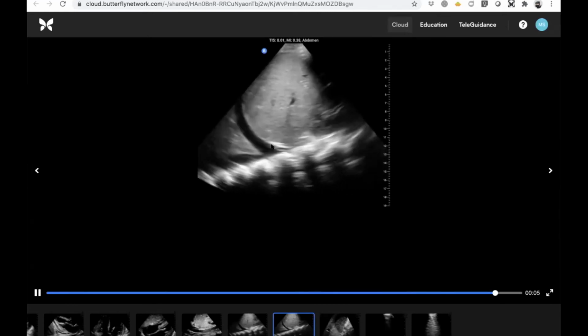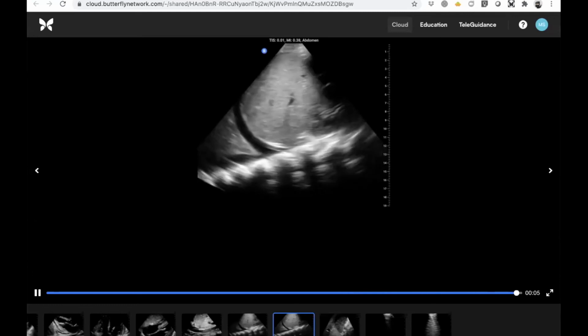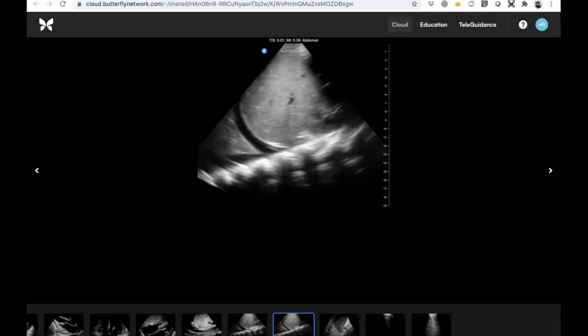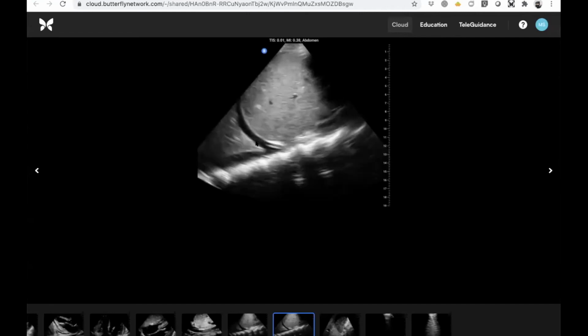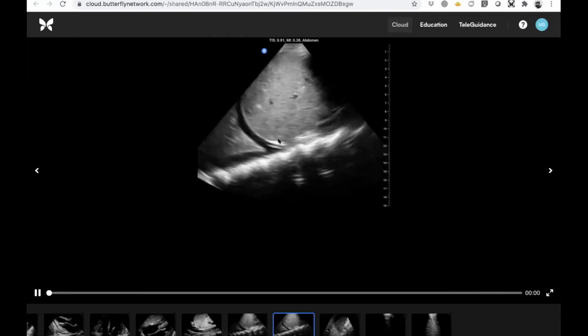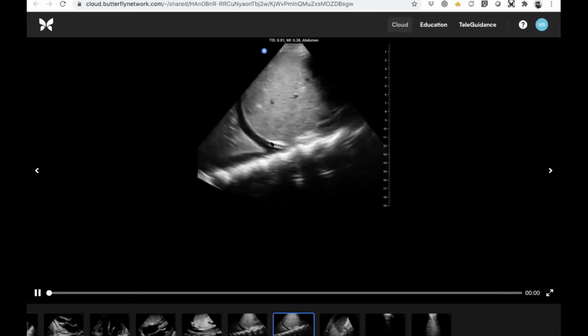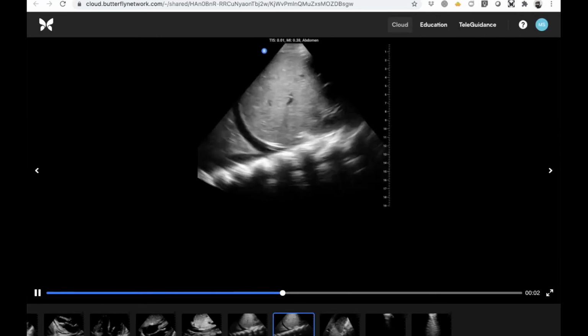One thing, you drop all these pearls that we just move quickly past. I want to rewind for a second. It doesn't mean it's fluid. Right? So anything in the chest that allows ultrasound to transmit through it without scattering, and that could be a lobar consolidation. So if you had a big right lower lobe pneumonia and no pleural fluid, you'd still see the spine sign coming up past the diaphragm. In most patients, it'll stop right here. You'll see the spine below the diaphragm, but you won't see any spine above. It'll just abruptly disappear. And if there's fluid or consolidation, you're going to see the spine continue past the diaphragm.